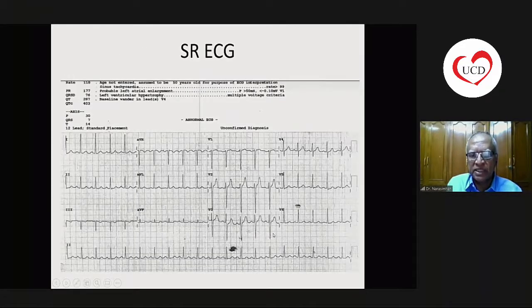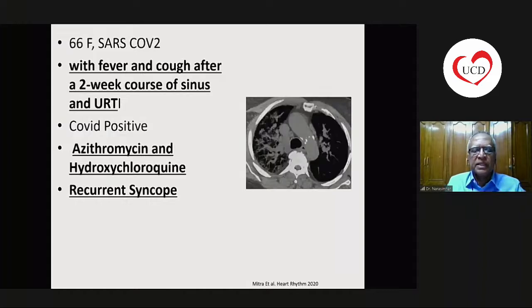And after conversion, this is what we have seen. Now, the second one is a 66-year-old lady with SARS-CoV-2, admitted in the ICU with fever and cough after a 2-week course, and was treated for sinusitis and upper respiratory infection. It turns out to be COVID positive. So, azithromycin, hydroxychloroquine, gets admitted with recurrent syncope.